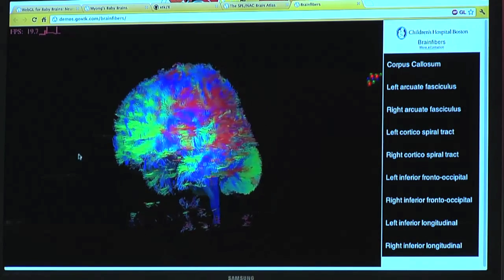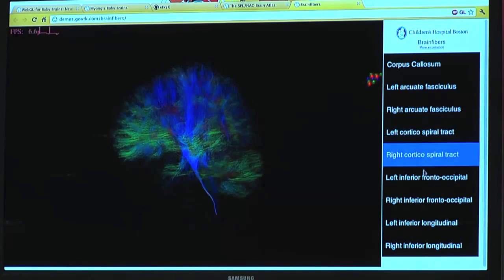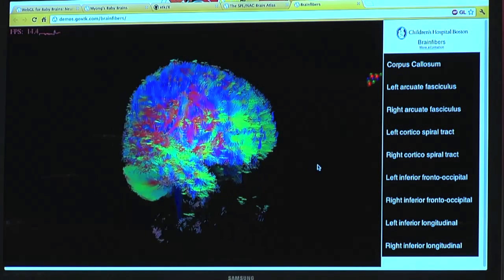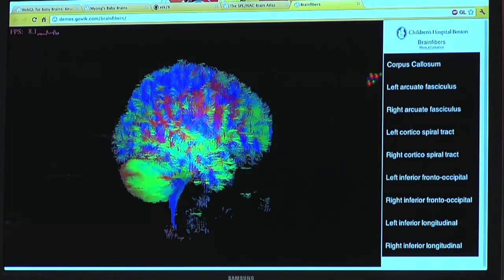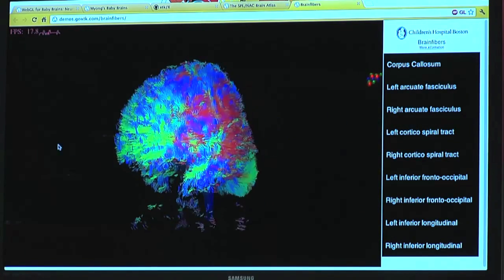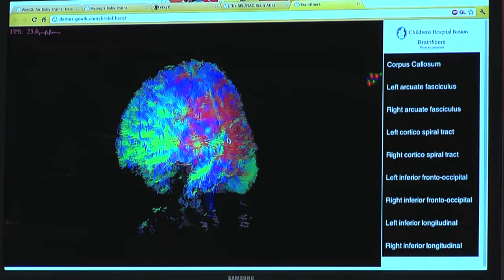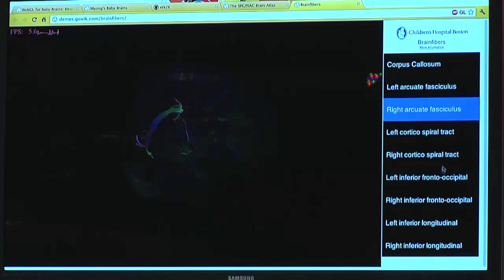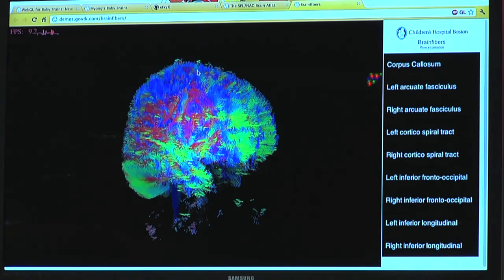If I now move the head to the other side and do the same thing, then I think this one is the real opacity, but since this one is very dark, that's a strange artifact, which I think is connected to this whole head being one object, so we don't order each fiber. I don't know if this would be performant at all if we did that. So we don't do depth ordering here and get this artifact. Here it looks like that, but from this side it looks like that. It's like it's connected to the normals and the transparency. So if somebody has insight, it would be great.